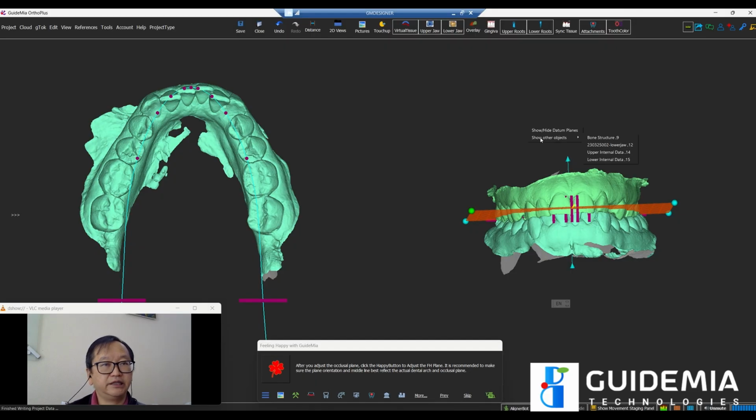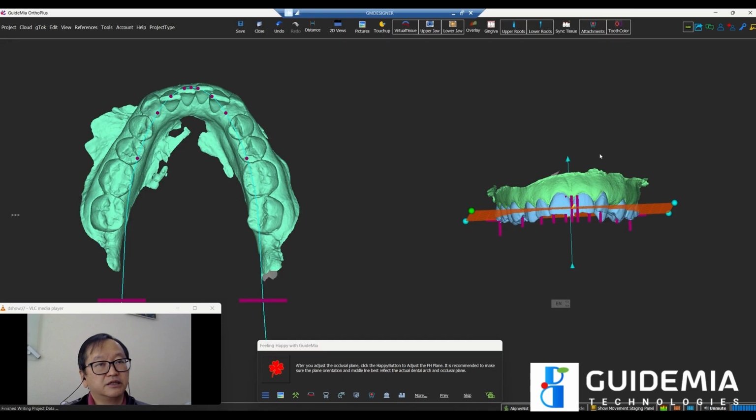You right click, you find the tools according to the context, according to the file or the models you select. Now we have internal data here. We call it internal data because typically we wouldn't expect users to deal with it. Let's take a look at this.